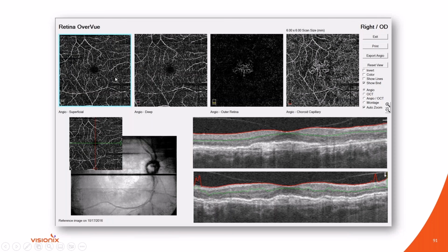Again, in this scan, in this patient, I can't remember if this patient was diabetic or not, but we're going to really focus on the 2 scans on the left 4 weeks from now when we're talking about capillary dropout and we're talking about retinal vascular disease. It's in the name. Choroidal neovascular membrane is not a retinal vascular disease. It's in the choroid. It's a choroidal neovascular membrane. So whereas in diabetes and retinal vascular disease, we focus on these 2 on the left, it's these 2 scans on the right is where I'm really looking for the presence of an abnormal vessel. Is there something growing here that shouldn't be growing there? And that is a sign of your choroidal neovascular membrane. So I'm looking for the presence of abnormal vessels, vessels that shouldn't be there in these 2 scans on the right.